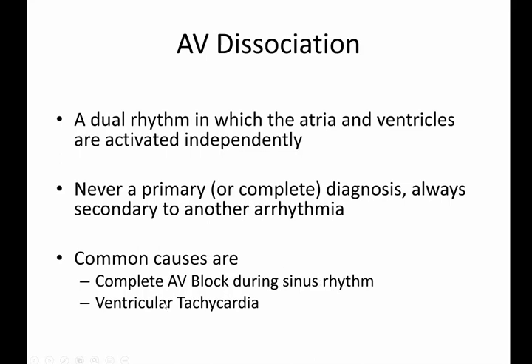The other common example is ventricular tachycardia. We all know that we consider AV dissociation as the hallmark of ventricular tachycardia, but we'll see in many further examples what the significance of AV dissociation is in the diagnosis of VT.